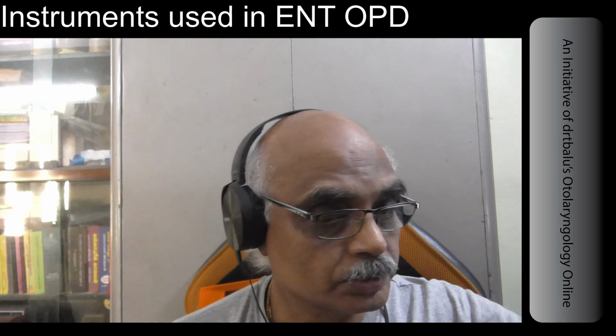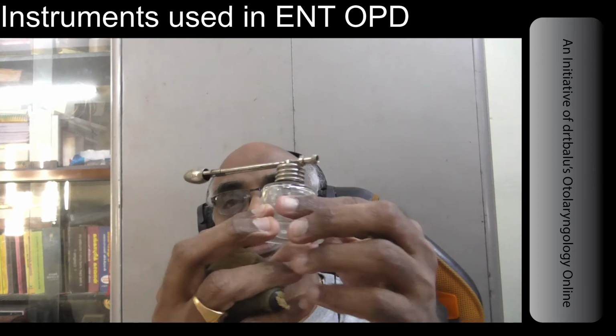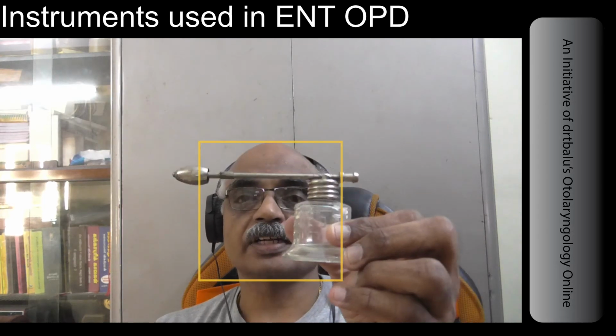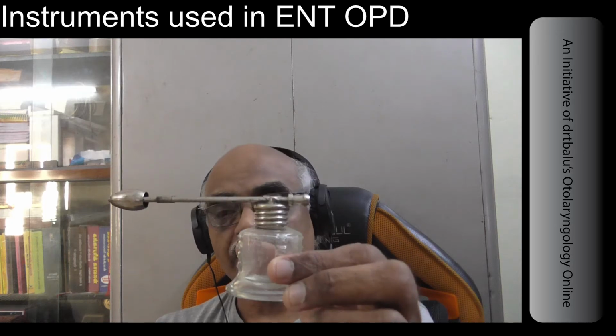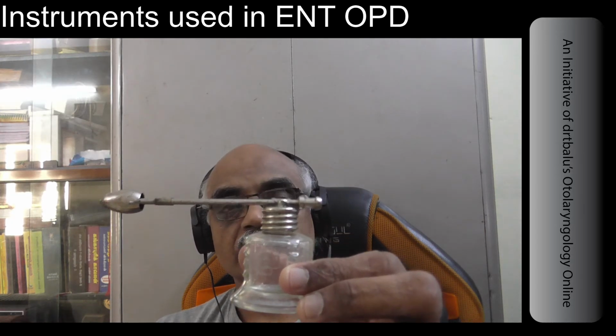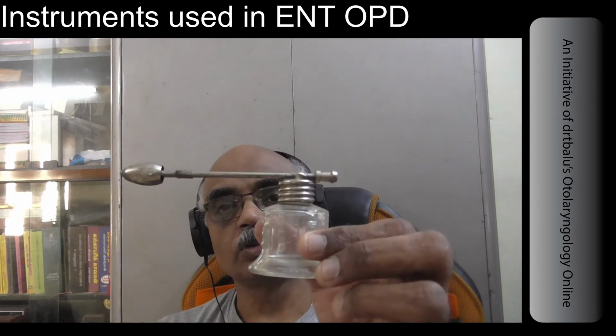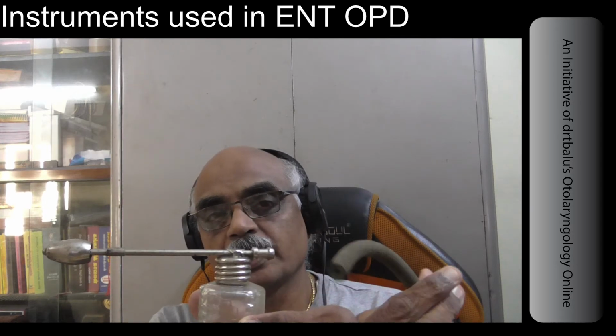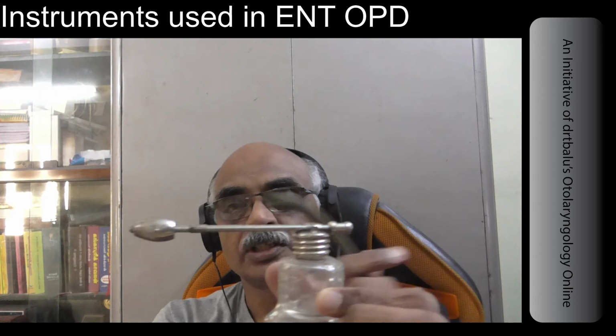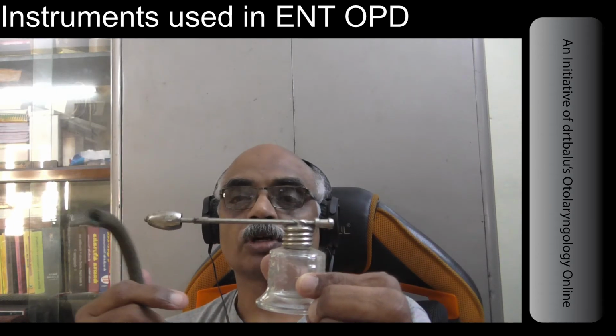The next instrument I am going to show you is the Hartmann spray. This is actually a relic of historical importance, because right now all the medicated sprays are available as self-disposable containers. This is what we were using when we were students. You pour the medicine into this bottle or jar, attach the bulb here, and compress the bulb. By compressing the bulb, you will be spraying the liquid out of this nozzle.